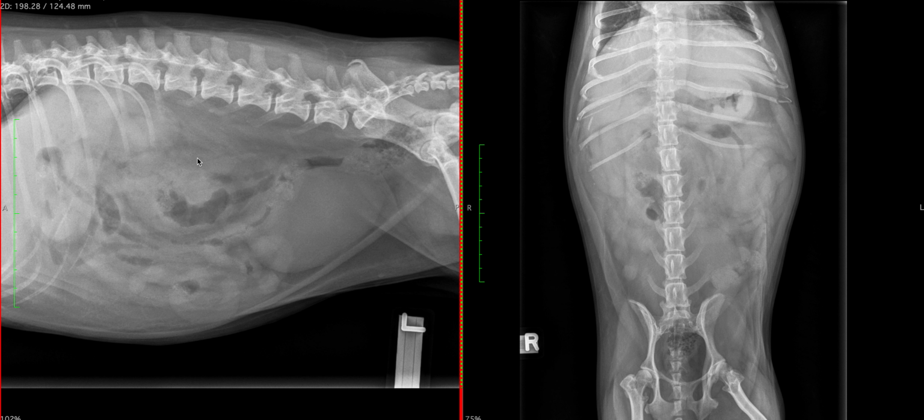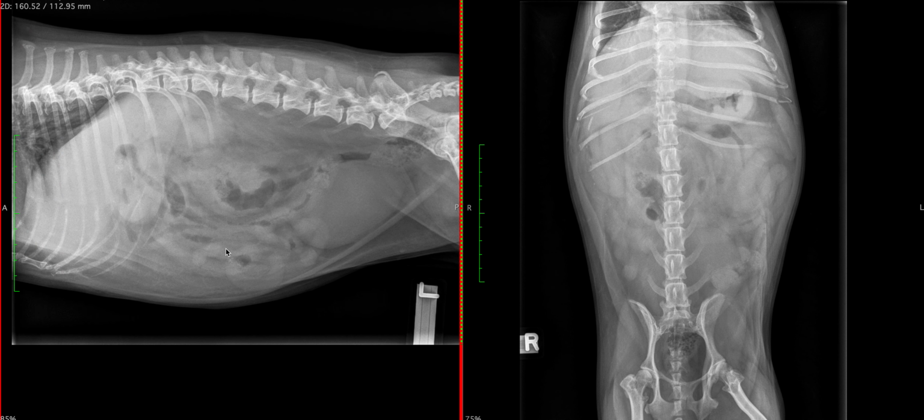Our principal conclusion in this patient is the loss of serosal contrast in both the peritoneum and the retroperitoneum. This is consistent with a mild volume of effusion. The presence of low volume peritoneal effusion can be significant in light of this patient's historical collapse, and this should be correlated with both the history as well as her physical findings, such as presence or absence of abdominal pain and pallor.